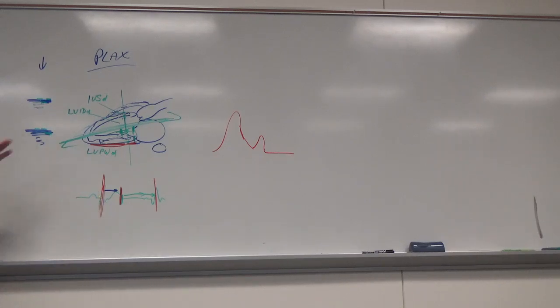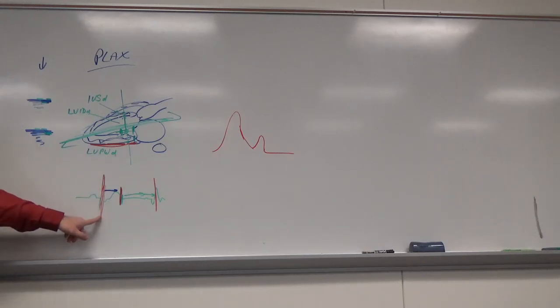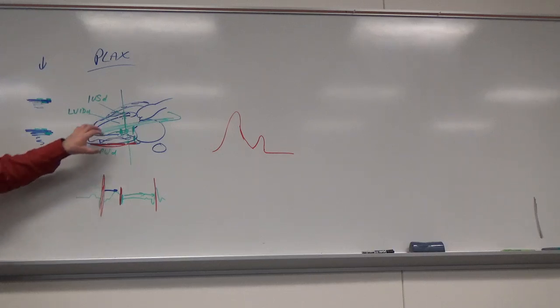If you're doing this visually, because Tammy and I both do this visually before we even look at the EKG. I actually don't even look at the EKG. I scroll this back and forth until the LV is as big as it can be. I'm scrolling back and forth until it starts going out, and then you scroll forward and then it starts going in, then I back it up until it's big again. I take it to its biggest diameter, which always correlates to the end of diastole.